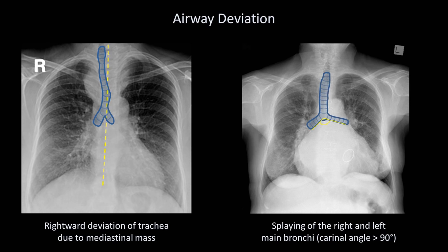Drawing in both the airways and the angle between them, known as the carinal angle, you can see that it is well above the cutoff of normal of 90 degrees.